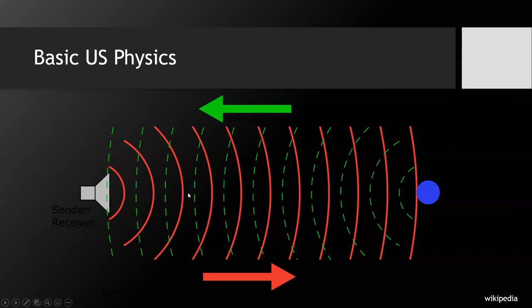But knowing the speed with which the machine has sent out an echo, it can then calculate the distance when it comes back. And so that's how basic echo works. Sends out an echo, hits an object, it comes back at the same frequency. And so it knows, based on the speed of sound in soft tissue, exactly how far that image is, and it creates this little echogenicity for you to represent that there was something there, right? Now, what happens if that object here was not stationary? What happens if this object was moving?